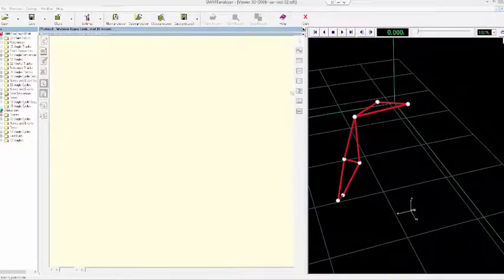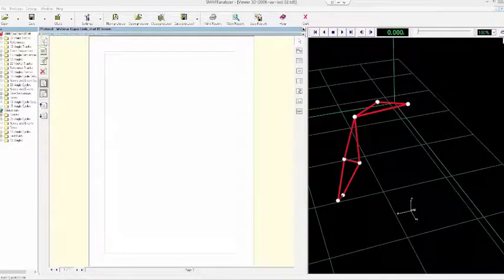The toolbar on the right contains the graphical objects used to display the data, basically plots, tables, text boxes, legend boxes, cyclogram, images, and video. The first step to create a new report is to create a blank page. To create a blank page, we have to click on this button, New Blank Page. Okay, so that's it. Usually the first page of a report contains a header with a title or a logo, for example, and then the subject information, and so on.